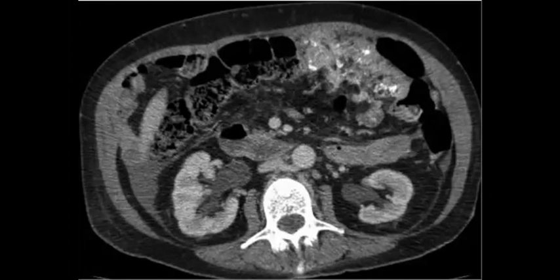So Huda, a small hypodense in the liver, but choose the obvious thing in the selected image better. So fluid adjacent, okay. There is ascites, okay. I agree with you.